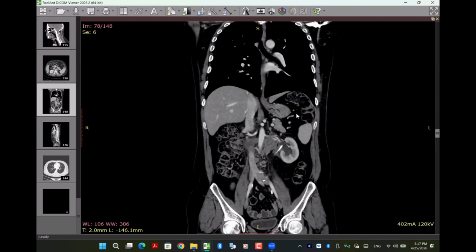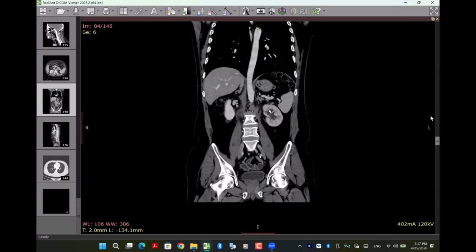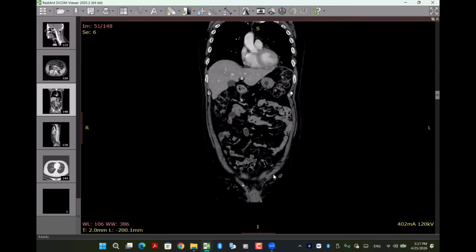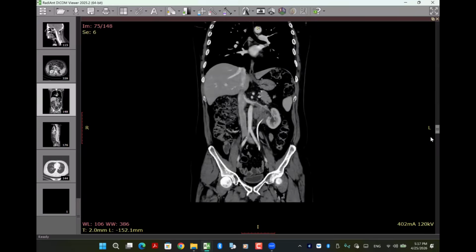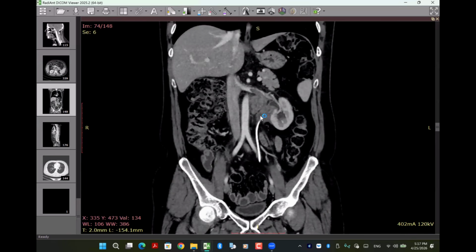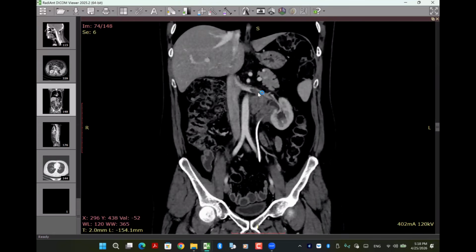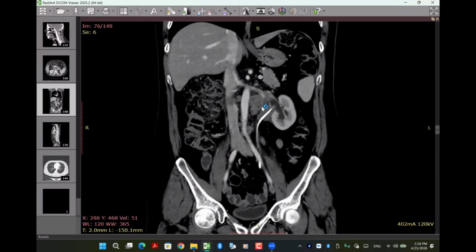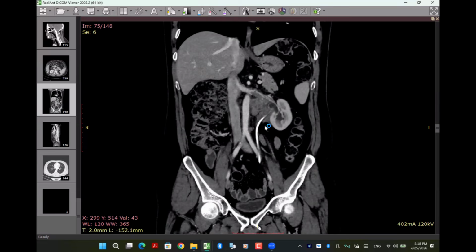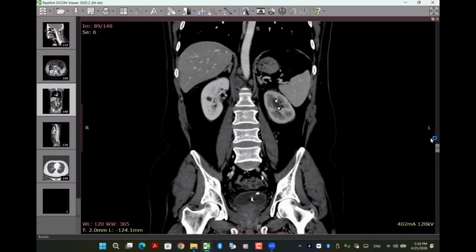Okay, actually this was a case of seminoma, post left orchiectomy. Never underestimate the left inguinal canal from this one. This was a metastatic para-aortic lymph node with invasion of the proximal left ureter, left renal pelvis, and getting actually inside the left renal vein, and this is a very bad prognosis for this case. Okay, plus the bilateral retrocrural. What else should you comment?